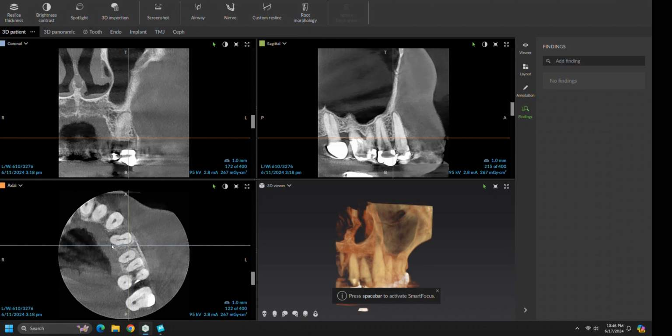If the deep probing was indeed that spot, then I would be relatively confident that this is the oblique fracture that we see in the CAT scan. If the deep probing was somewhere else, then I would be second guessing our diagnosis and recommended treatment.